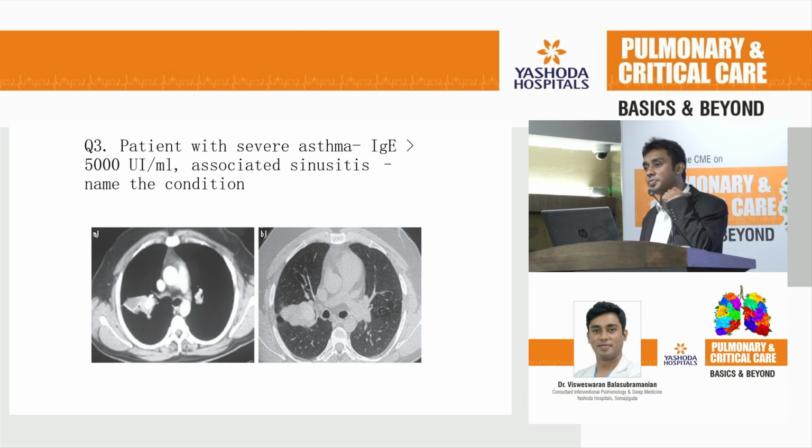So what are the findings? Please stand up. What is the finding and what are you seeing in the CT scan? What do you see in this? Generally, you don't see consolidation in the mediastinal window. So in parenchyma, it looks like a mass or a consolidation, but the same thing is also seen in the mediastinum. So what is it?